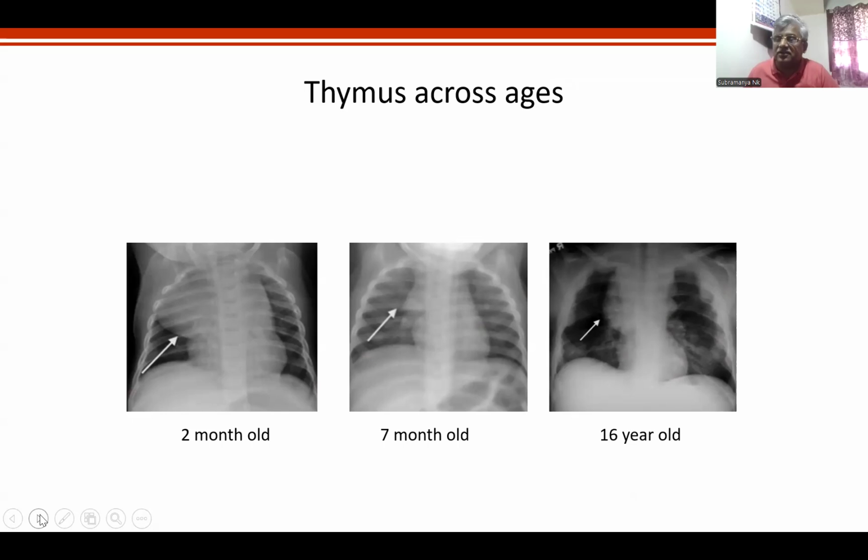The aortic arch is posterior. If a shadow silhouettes the aortic arch, it is in the same plane as the aortic arch. That means it is posterior. If the aortic arch is seen distinct from the radiodensity, that means it is not in the same plane as the aortic arch. It has to be anterior, because the most posterior structure is not the arch, sorry, the abdominal aorta. The aortic arch goes like this, back. You understand? I mean to say the abdominal part of the aorta.